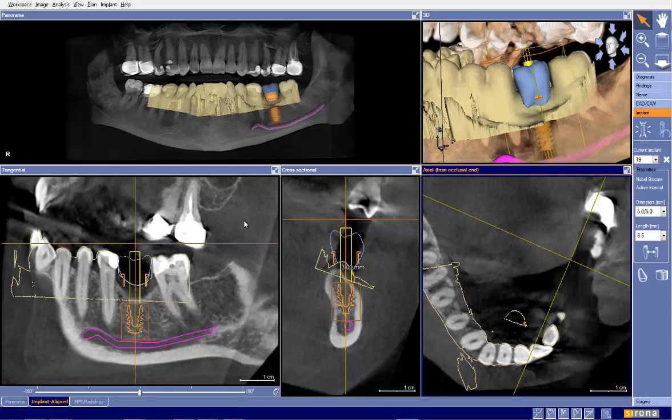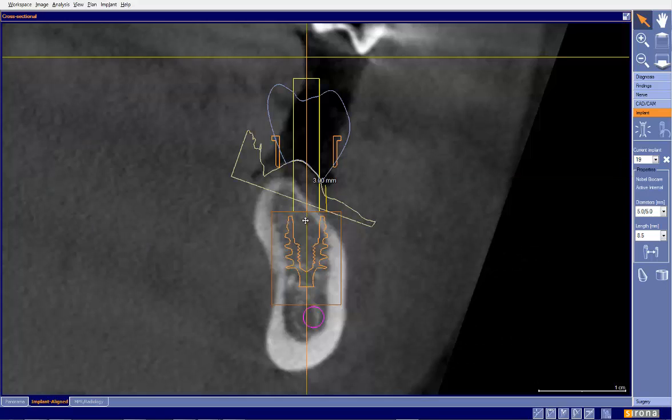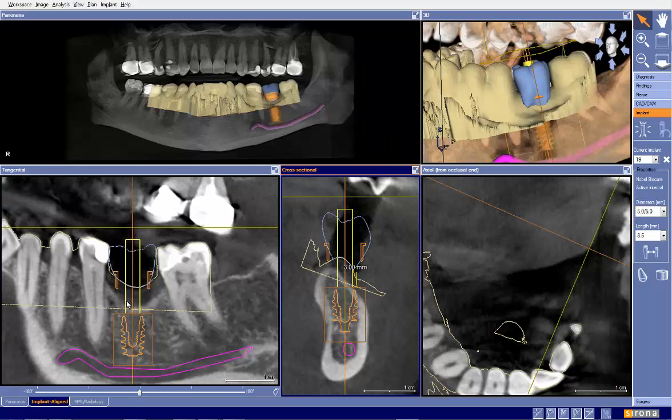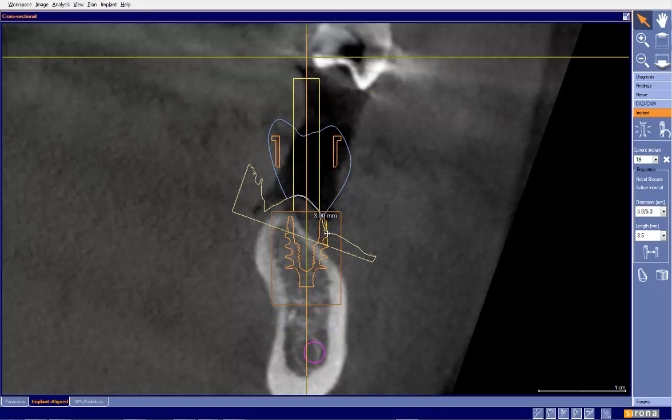Now, let's focus on the implant plan itself. What I see very often is the desire to avoid grafting, and so the implant is placed quite deep. In this particular case, one option is to place the implant deep and remove all this bone. I have tremendous concerns about removing so much bone and what it does to the interproximal bone and how it affects the restorability and cleansability of this case. For me, this case is pretty straightforward. I would move the implant way up here, probably about right there.